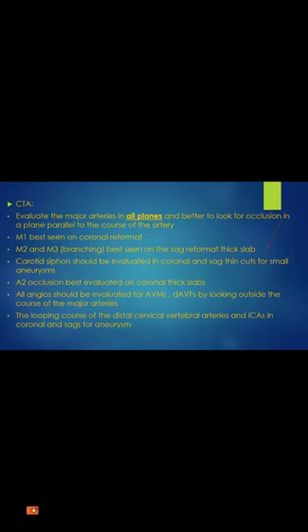Sometimes your imaging protocol needs to be optimized just to have a general look at how the vasculature looks overall. Maybe you need the MIPs, maybe you need the 3D MIPs, just to have an overview of the vasculature, because that sometimes would give you a better idea of maybe an aneurysm, maybe asymmetry in the vascular diameter, maybe it's smaller on one side, maybe there's an occluded upper or lower branch of the MCA or M2 that you may not be able to find if you just scroll the axials.